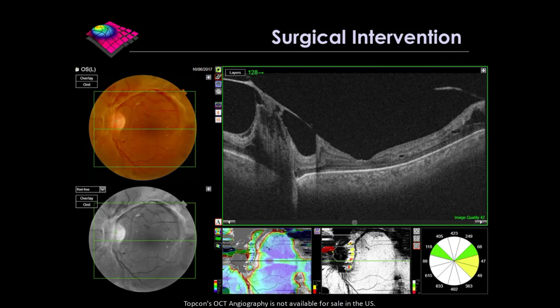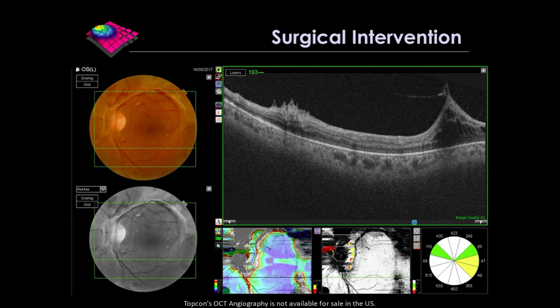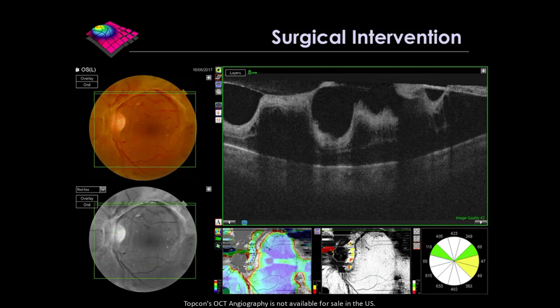So this unfortunate woman presented with bilateral tractional retinal detachments. And what I want you to pay attention to here, and it does look so much more dramatic on the red free images, is her fovea. Vision is 6/9 in this eye, and her fovea looks okay, relatively speaking, of course. Now we look at some other cuts, and you can see this traction element down here below the optic disc, and then above you can see multiple areas of pulling on the retina. So just try and remember how she looks now.